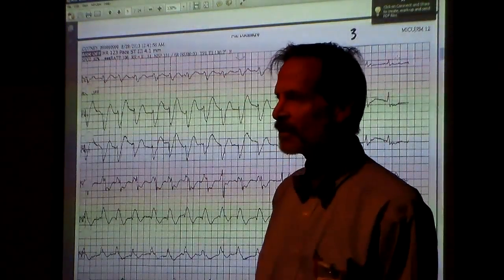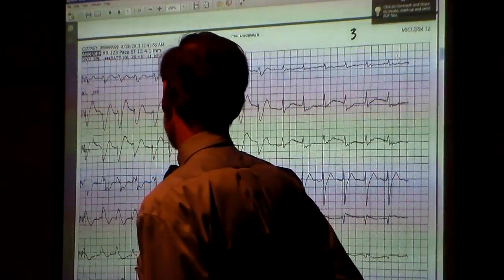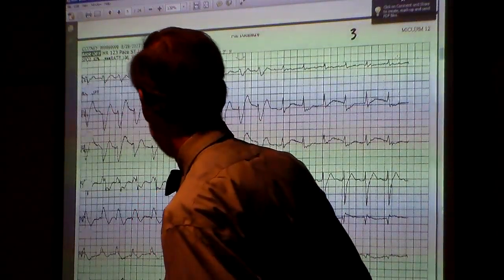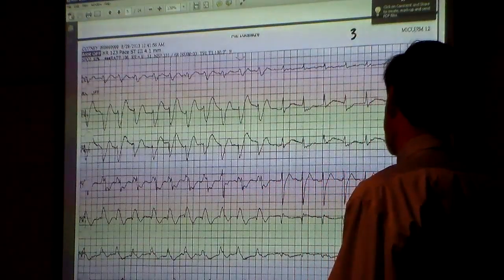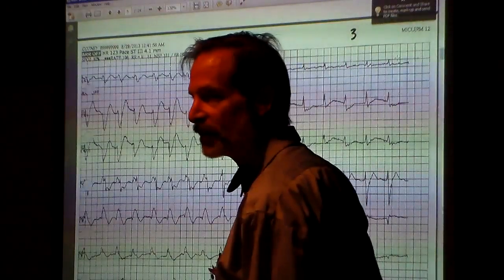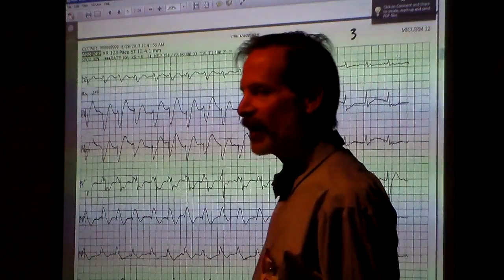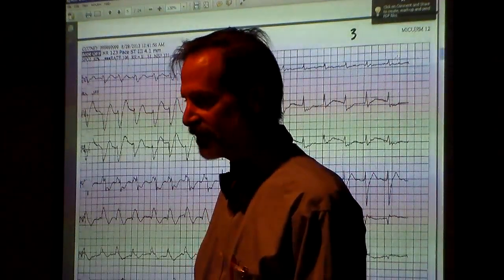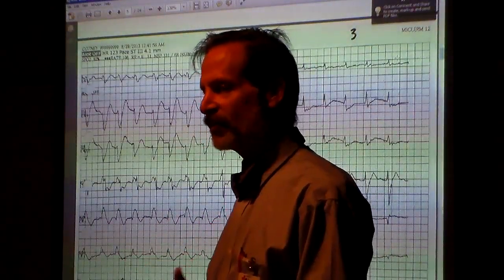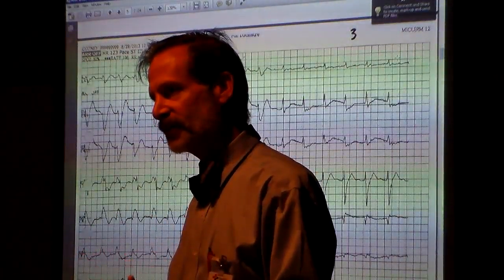Yeah. So did this patient get something and convert? Yeah, I don't remember. Actually that must have been a GMS patient because that's a new EKG. So the person just happened to convert right in the middle of that strip. So what would explain the wide QRS? I think it's just, like you've heard of a rate-related bundle. In other words, that's the same thing as aberrant conduction. If you conduct so fast that the tissue isn't able to repolarize completely, so conduction is slowed, we call it aberrancy.